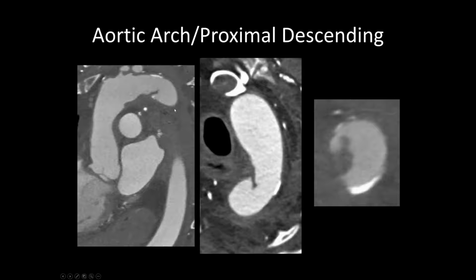So this finding was pointed out to the interventional cardiologist because we knew the patient was going to end up going to cath for the left circumflex lesion. And so they were asked what should be done, how should you do the cath. At first they were thinking that it's just an artifact, but when they were shown these different images, they were a bit more concerned about an atheroma. So they decided that maybe instead of taking a femoral approach up the aorta, where there's a chance that you might come across this and end up disrupting it, maybe a more radial approach would be taken so that you bypass this completely, come from this side, go down, and then take a look at the vessels. And that's what was done.